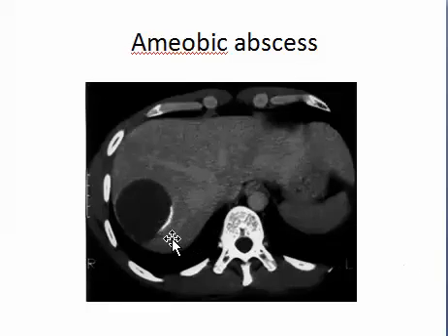Abscess with calcification is typical for amebic. Of course, hydatid disease is another possibility. That means parasitic affection usually tends to calcify.